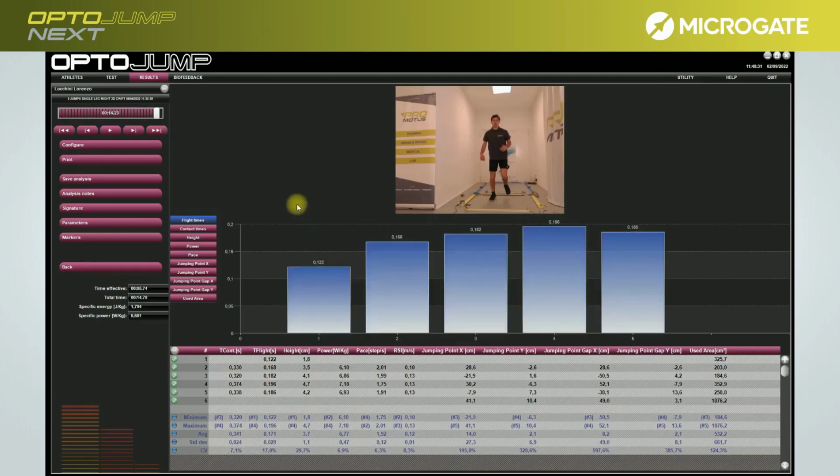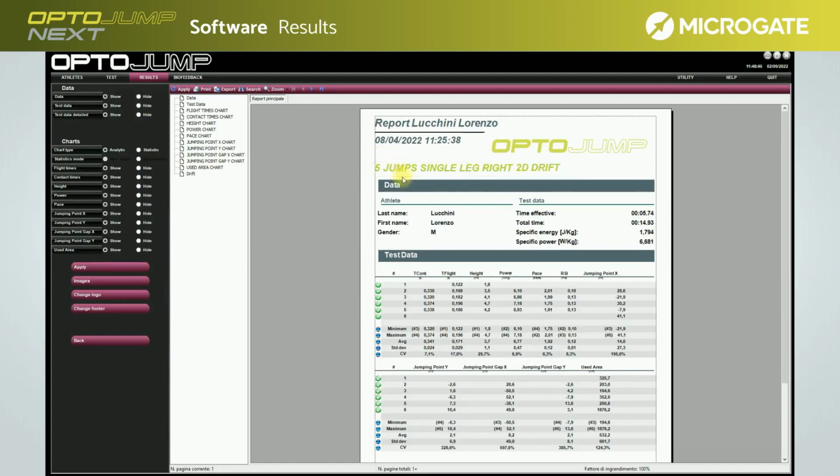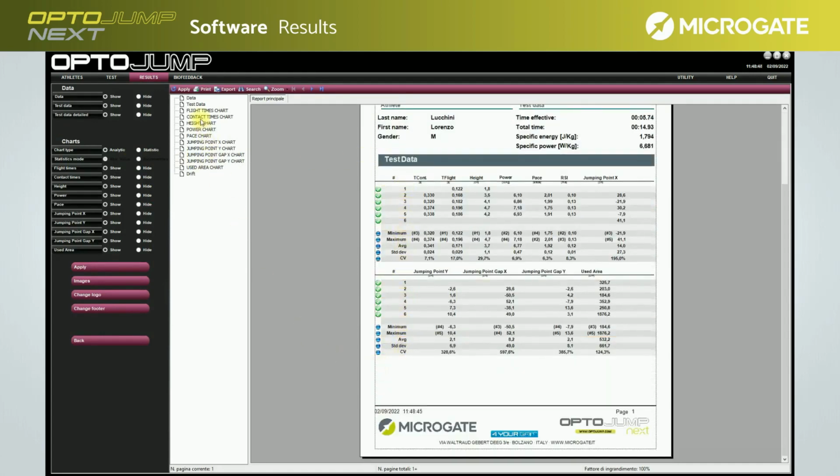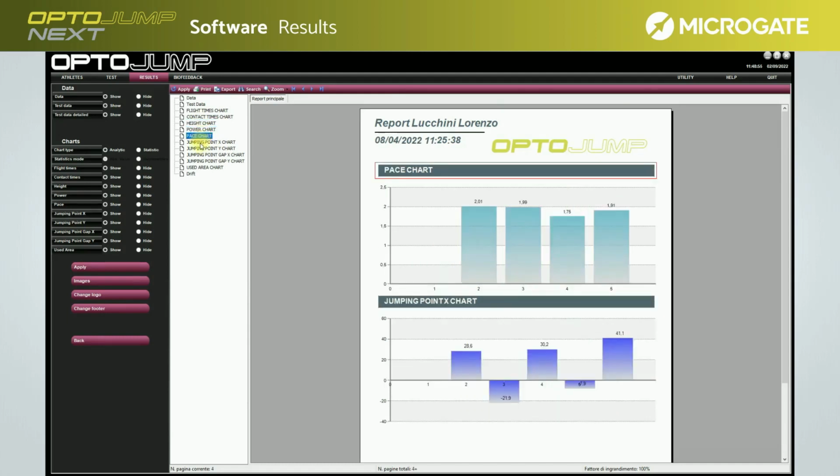At the end of the analysis of the results, the software gives the possibility to display the data by printing dedicated reports. On the screen of the selected test, the Print button displays a preview of the reports with all the data corresponding to the test in different formats and graphics. Report, which differs by test type, will be explained in detail in the next chapter.